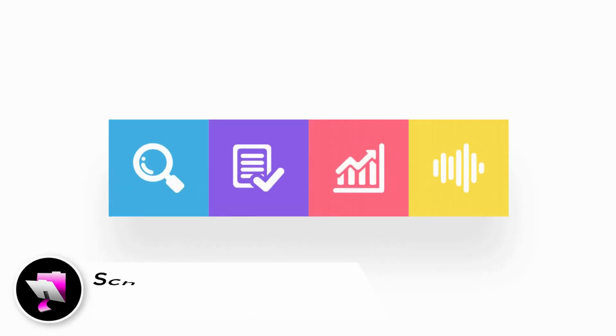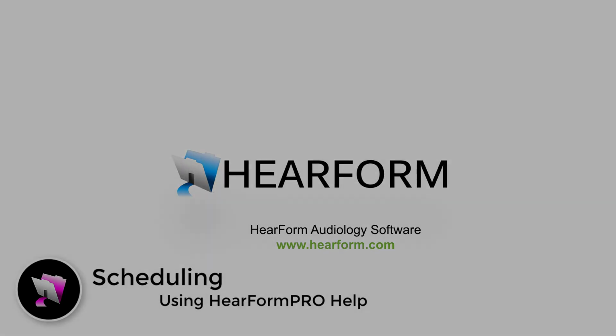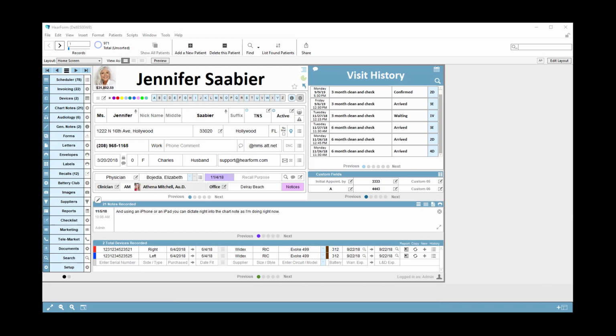Welcome back. This video will explain how to use the help system within HearFormPRO software. There are a few different ways to use the help support system in HearFormPRO.